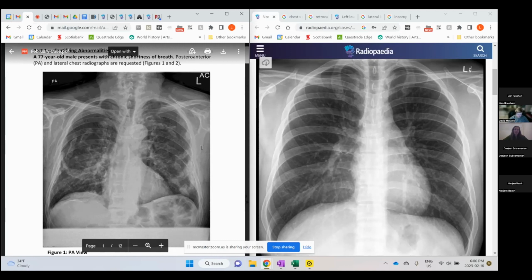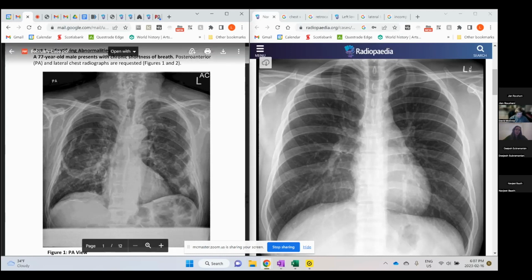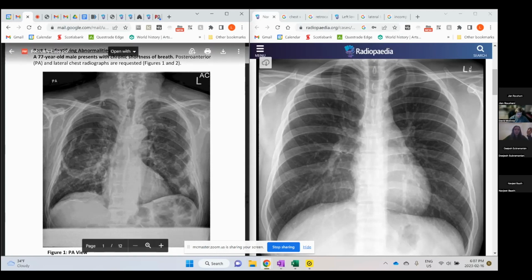So before that, I'll just say my approach. I usually start from the airway and then the lungs, and then you want to compare. Symmetry is basically your best friend in radiology. So this area should look like this area, the middle should look like the middle, and lower to lower, and it should be pretty uniform throughout the lung field.